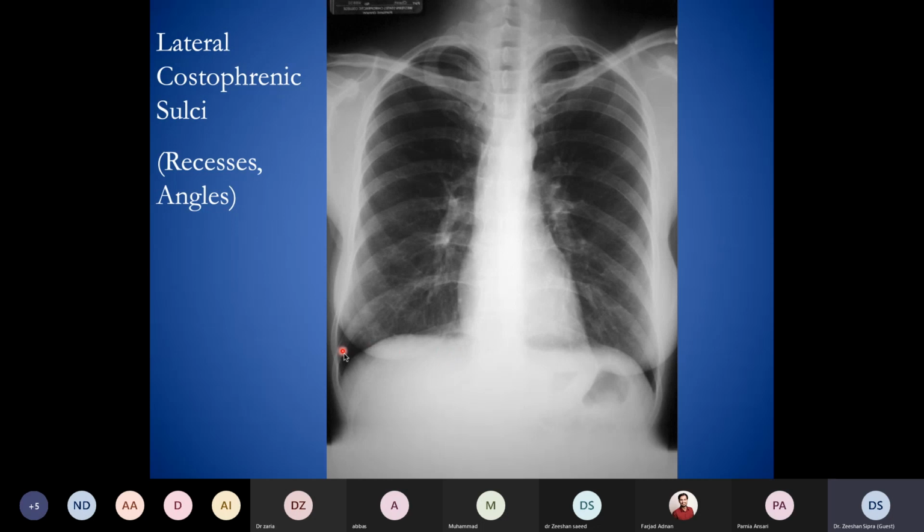But even haziness in an AP view, which is an ICU setting, or a fluid level in an erect posture, suggests effusion. Even slight blunting, a size of a few centimeters, is near 300 milliliters of effusion, because a PA radiograph is quite less sensitive as compared to the lateral radiograph to detect pleural effusion.